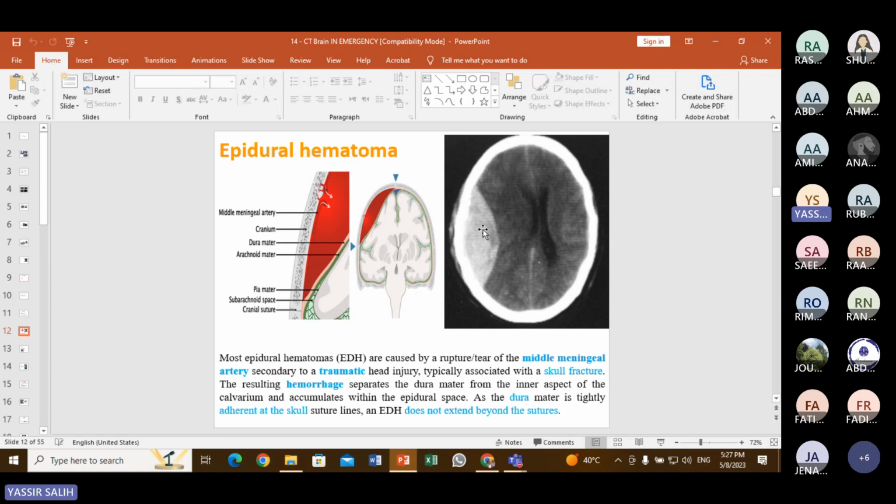What about the shape of this lesion? Concave. ليش concave? Why concave? What is the difference between concave and convex? لا قصدي convex. معلش تتفهم. Convex لأنه صاير كذا منعكس. Yes, this is convex يعني محدد. Convex. اللي هي biconvex يعني the other side also convex, the contact with the skull, and the inner margin also is convex, so it is biconvex. Two margins are convex, biconvex.